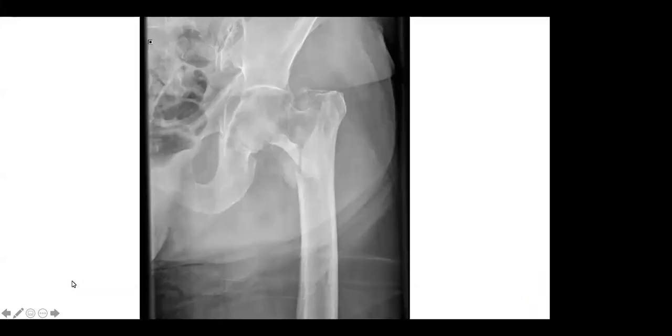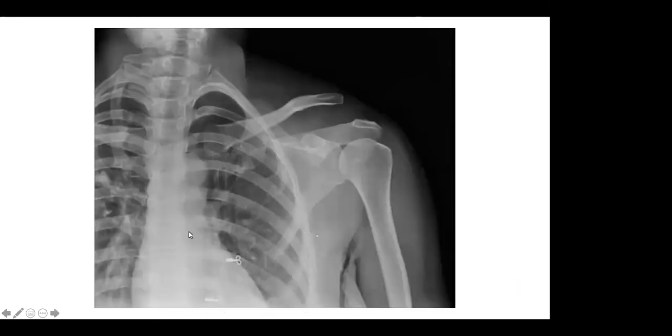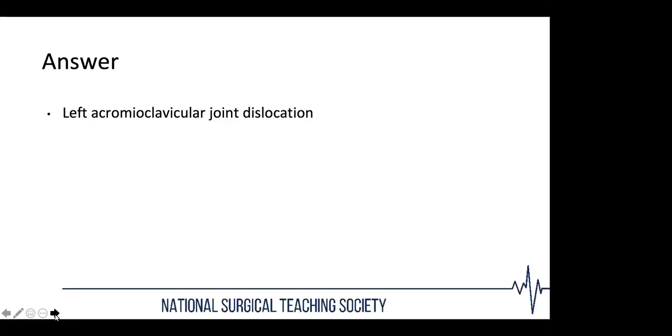And this one. Someone did ask for the last image, what were the white things near the heart? Let me go back. Oh, so that's clips on clothing. So again, very good spot. It shows that you've got your eye in on the images, and that would not be classed as a foreign body in the abdomen or in the thorax. It's external, it's on the patient's clothes.